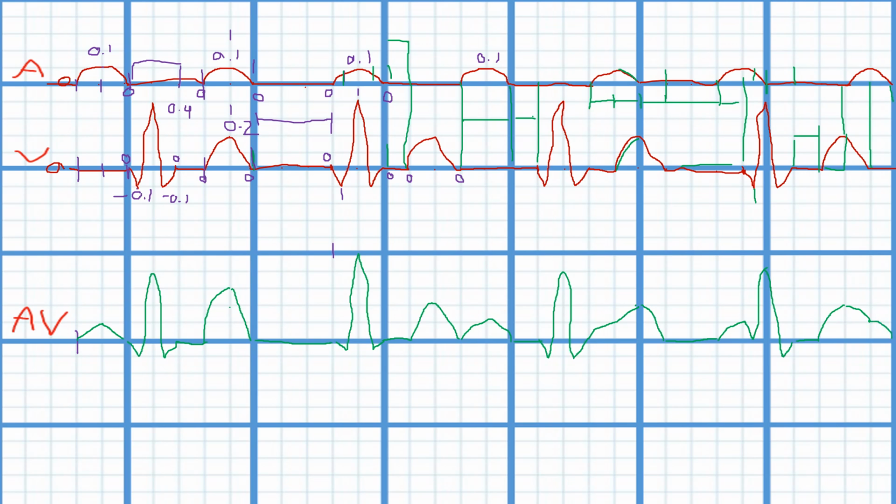And so you look at this, and this looks all sorts of crazy, right? This is why they say it's an irregular rhythm, because it's going to look very, very irregular. Let's go through and analyze this thing. So here's your P wave. Okay, yeah.